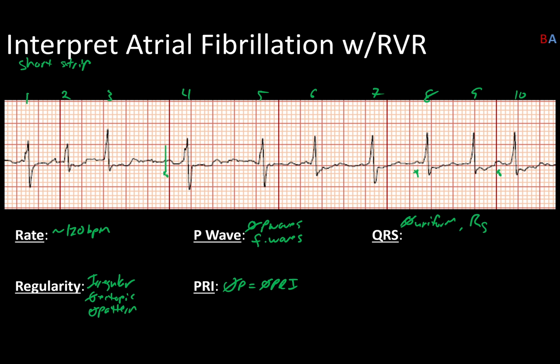When we measure them out, let's go ahead and look at a few different ones. If we measure this one here, and let's say he ends here, that's 1, 2. So this one's about 2. And we'll measure another one that looks really different. Oh, this one looks really different. Number 3. And that one's also just right at 2. We can measure one of the other ones here to here.